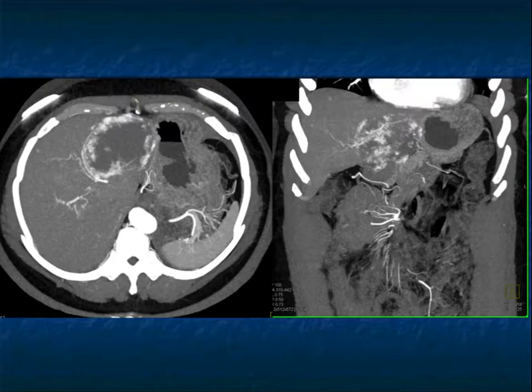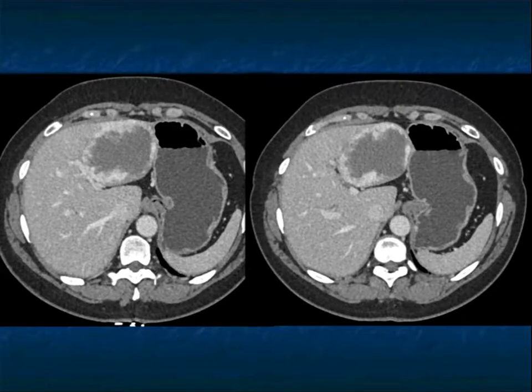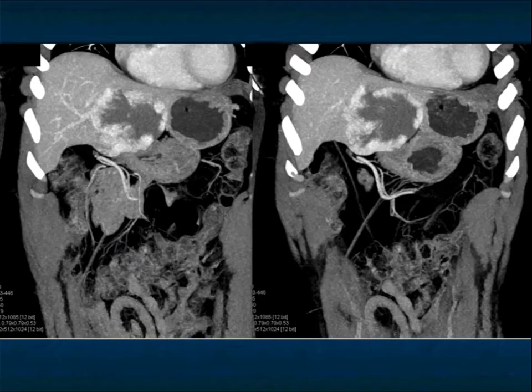And here's again the lesion filling in as we look at the sequence of images. In terms of hemangiomas, I mentioned that typically arterial and venous, I'll make the right diagnosis. But if you're uncertain, delayed phase imaging at 4 minutes, perhaps the filling in there will be more convincing for you. Two lesions that can benefit from delayed phase. One is hemangiomas, in those cases where we are uncertain. And the second, perhaps, is cholangiocarcinoma, which at times will show better on the late phase imaging.